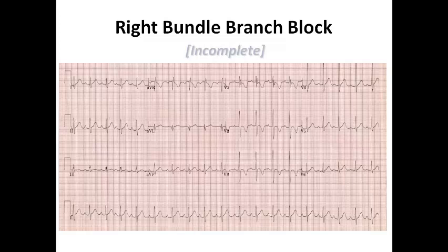We could find that there is complex morphology characteristic of right bundle branch block, like the RSR' pattern in V1, and we could find the slurred S pattern in lead 1. We could find it as well in lead V6, and the same morphology in AVR. But the complex duration here is relatively narrow, as it is less than 120 milliseconds. We can't call it completely normal complex duration. It's slightly prolonged, but not above 120 milliseconds, and that's why we call it incomplete right bundle branch block.